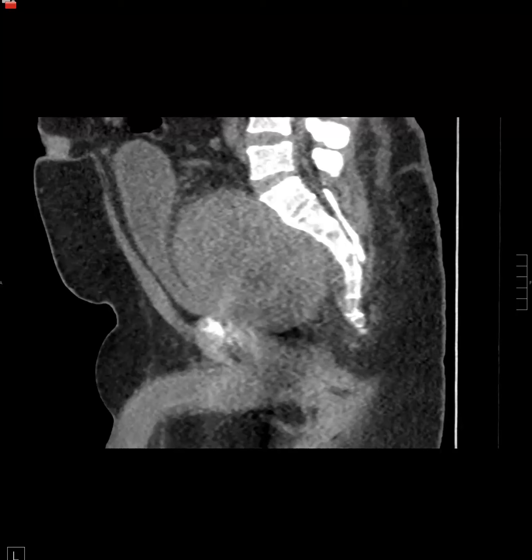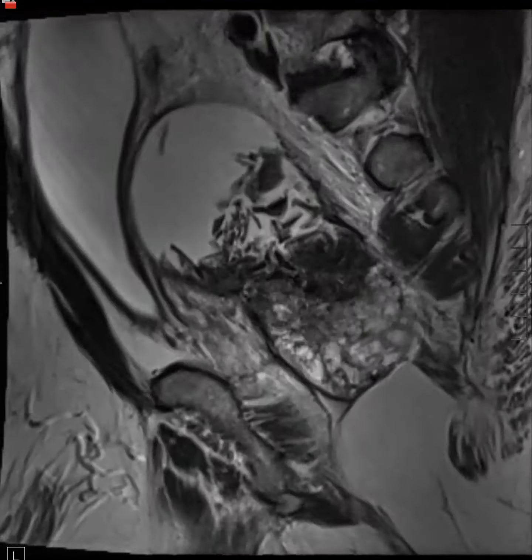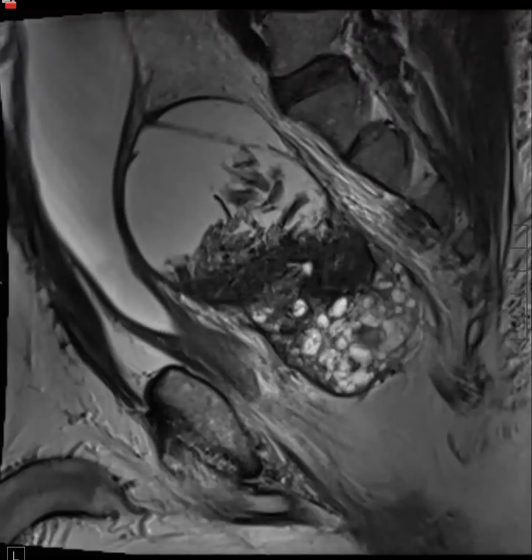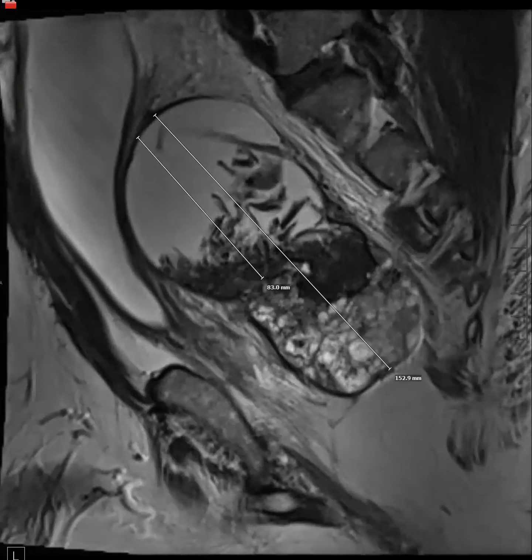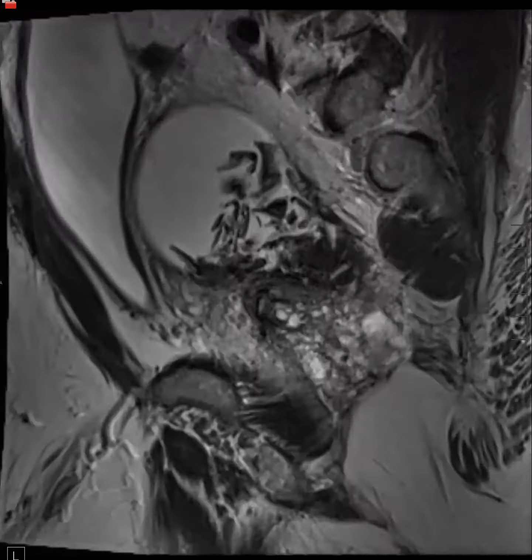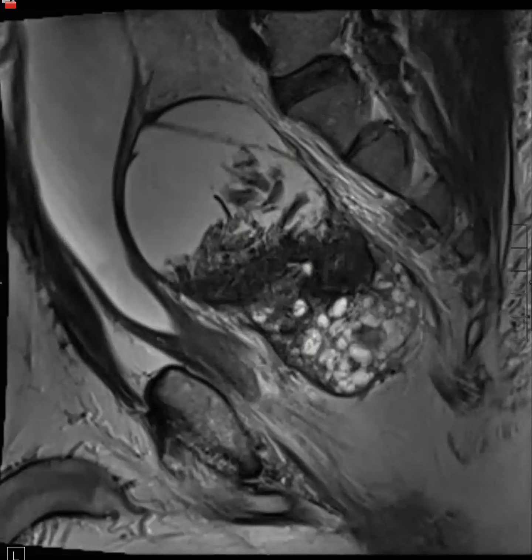The patient did have an MR, and the MRI was after part of the resection. The pathology from the HoLEP specimen showed hemorrhage after the procedure, but it was a fibrous tumor. This is a fibrous tumor. Of what, the seminal vesicle?